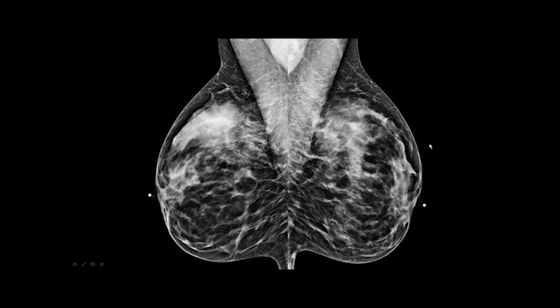So these are beautiful accreditation images, absolutely beautiful. We know the densest part of the breast is anterior, central, and going lateral, plus it's superior in the breast. So if you look at the center of the image, it's about 2 centimeters above the nipple. Your technologists have photocell markings on the paddle. The only ones that are manufactured that do not are GE, but if you have any type of GE machine, just draw a little black line on the paddle on the inside, and that will help the technologist be able to see where the center of the image is.